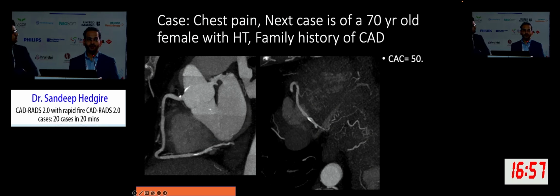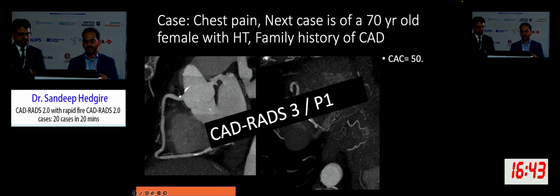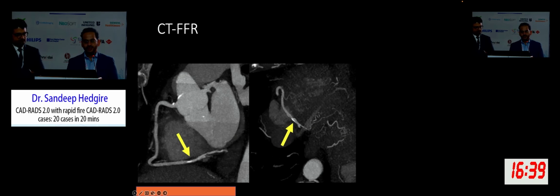Raise your hand if you think this is CAD RADS 3 or 4. How many people for 4? How many people for 3? Okay, I read this as CAD RADS 3, and because there is calcium score of 50, I gave a plaque burden of P1.